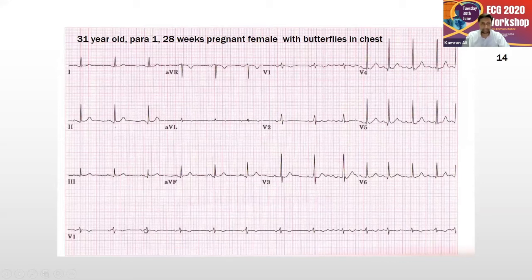Initially, the patient has sinus rhythm, QRS, T-wave inversion in lead V1, RSR prime, but not really that wide, still a narrow complex, so it can't qualify as a bundle branch block. But what happens is that the patient goes into atrial fibrillation. So that's responsible for the patient's fluttering.